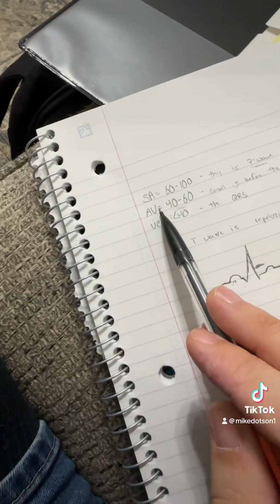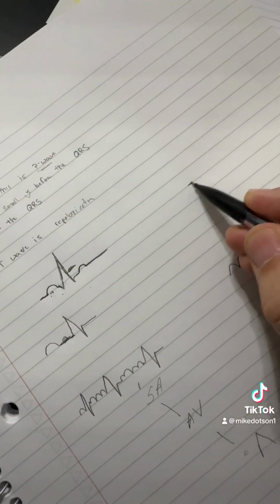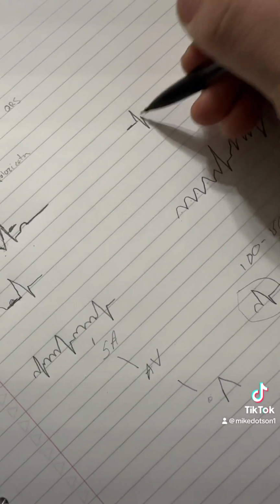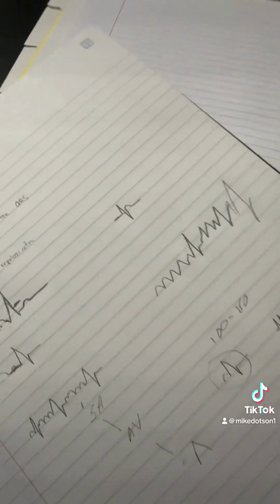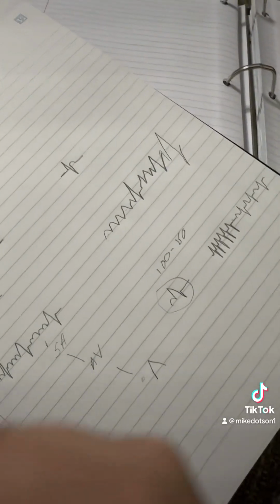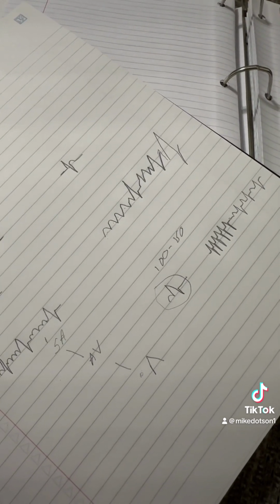Now, going back to the AV node, that's a rate of 40 to 60. When you see that, you'll see an EKG strip that has no P wave, but has a QRS that is narrow. It's a narrow QRS without a P wave. This can be common in a lot of people too. In a lot of athletes or people who are really healthy, you could see something that looks similar to this. A lot of times there's not much treatment for that unless they're symptomatic.